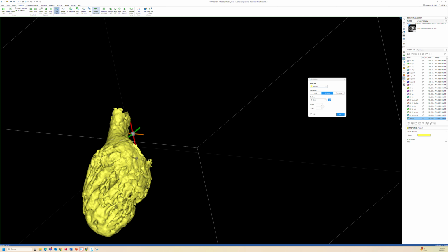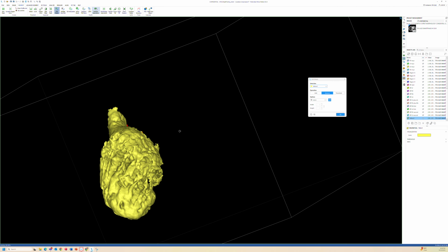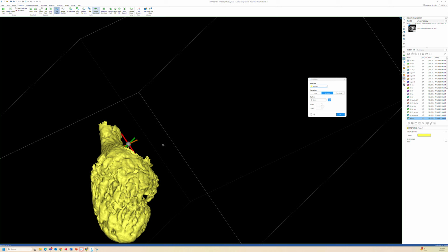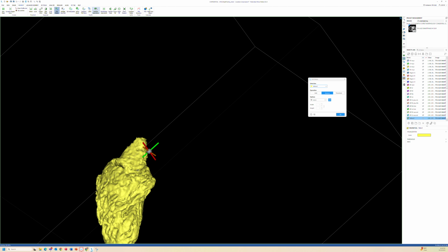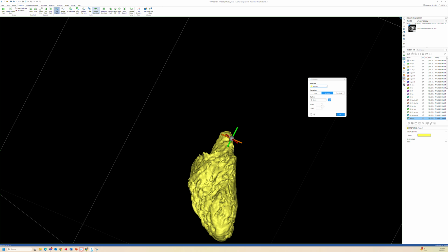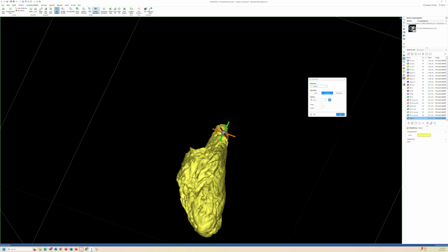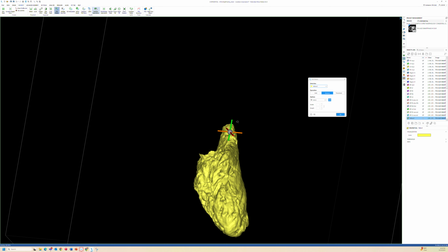And then you come around to the next iteration of that valve, getting it angled about right. And now, like that, move it over. Now I've got this last cusp here, and so I just want to get it so that there are no markers in the way, but you can kind of see through it. You can get it where I'm cutting right through that.